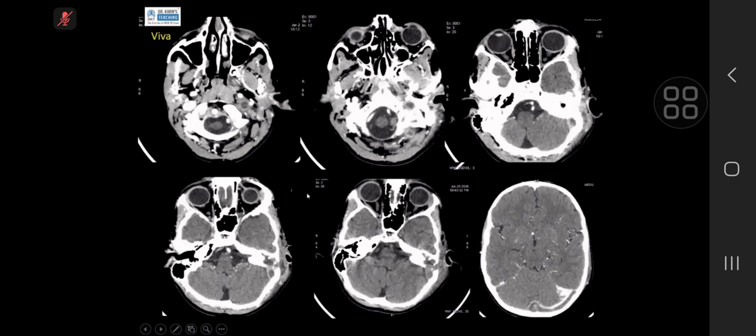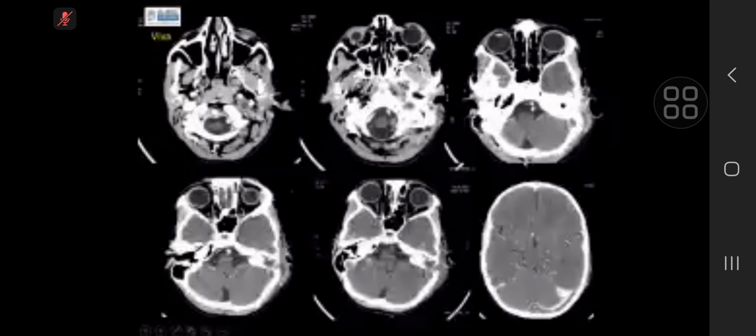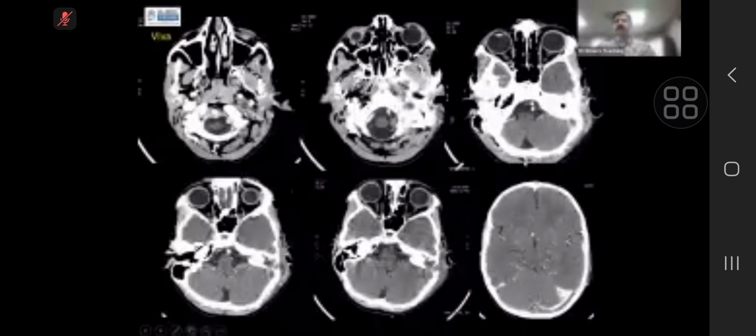Looking externally as well, there appears to be some enhancing soft tissue external to the region, seen at the upper right image. I'm not sure what that could be, but the filling defects could represent thrombus. Then looking externally, that one could be due to an infection.